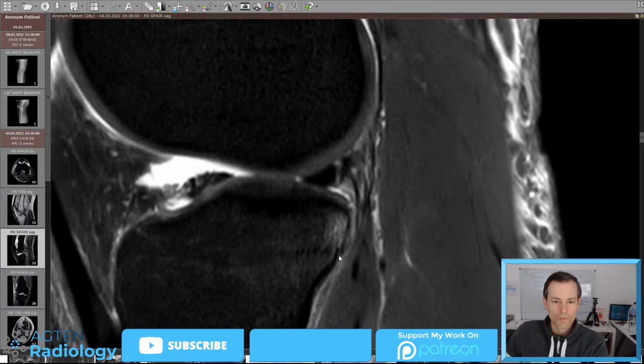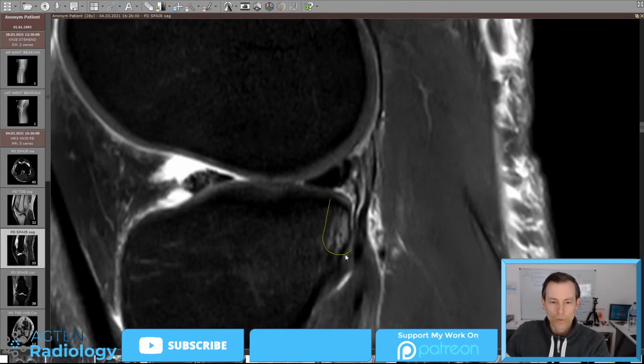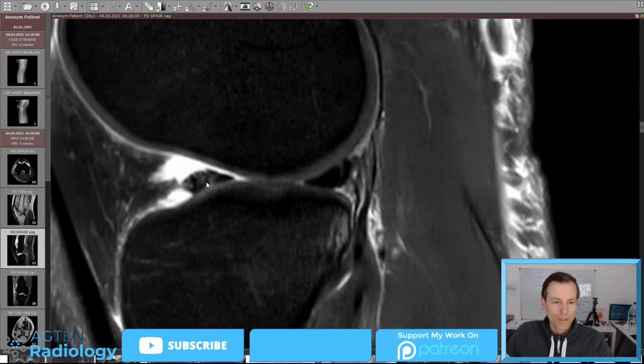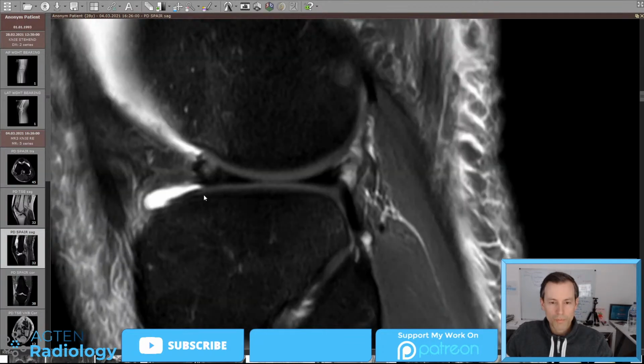There's a little step off of the cortical bone, so we have this posterolateral fracture as well, maybe some cartilage damage overlying here. This is just the normal stuff you see after ACL injury, right? So probably the anterior horn was also injured, either by contusion or just some complex tearing here, maybe even a vertical tear here. But it's not like fully ripped off out of the bone.